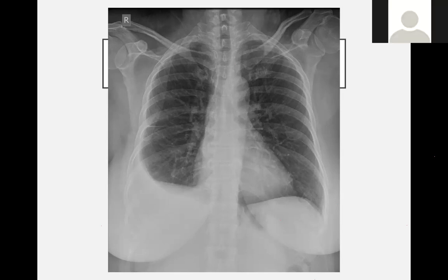Okay, cool. So we have an unidentified patient, probably female. The X-ray quality seems appropriate and examinable in terms of rotation, inspiration, penetration, exposure. So an appropriate X-ray. In terms of actual chest X-ray findings, we have a central trachea.